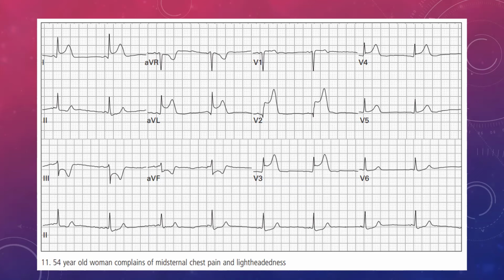But the question is, why is it a problem? And I think even if you were to show this to a second year medical student or a first year medical student, or somebody who maybe has seen an ECG once in a while, they'll immediately tell you that something doesn't look right.